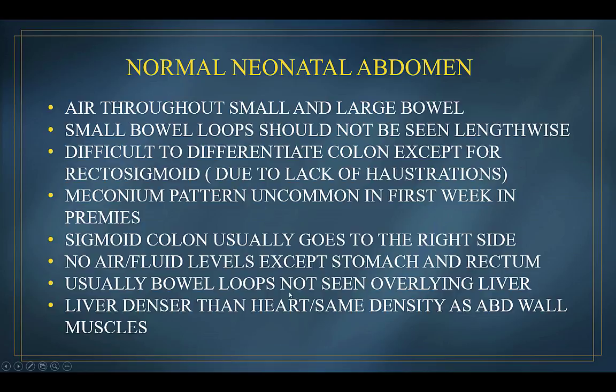and they usually have absolutely no significance. And I've already said, usually you do not see bowel loops overlying the liver unless you have extreme diffuse distension of the GI tract, and I've already talked about the density of the liver.